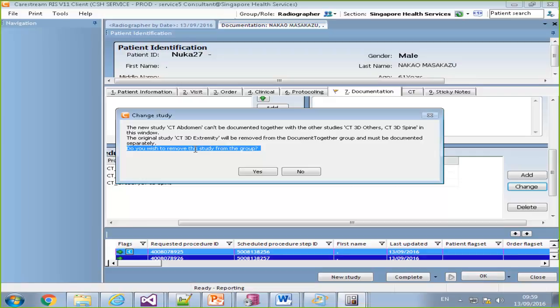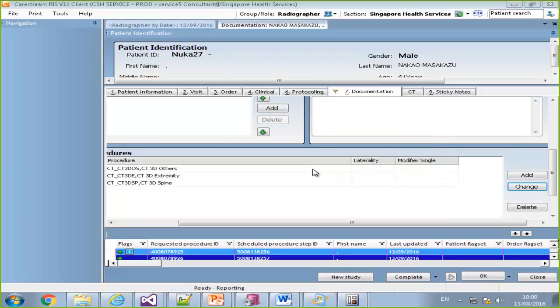Even though we've tried to make it invisible, one of those studies is loaded in the data window and is the primary study that the others are going to be copied from. Yeah. So this is the one area where this matters. Other than this one scenario, it's essentially invisible to the user. Okay. And probably it's not going to happen a lot, that it's a different group. Okay.